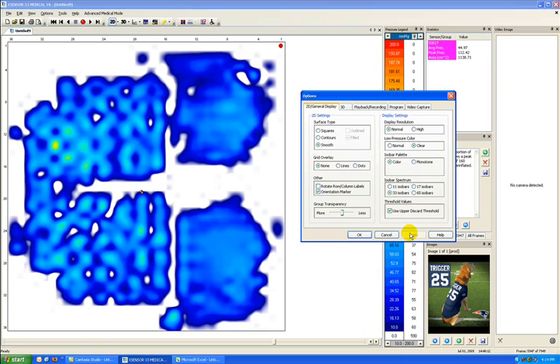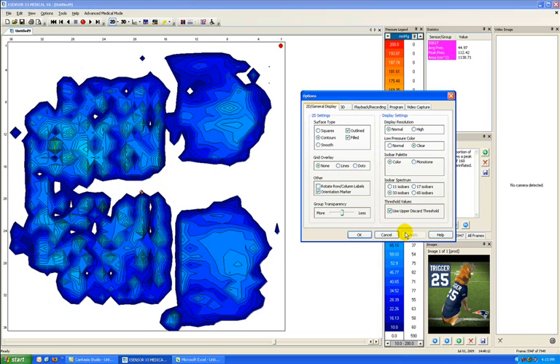And again, the pressure image changes appearance to smooth over any bumps or changes in pressure. I prefer contours generally. We can also select whether to outline or just fill the points out. So if we click on outline and then apply, we see an outline of where pressure changes, so it's easier to delineate between areas of different pressure.